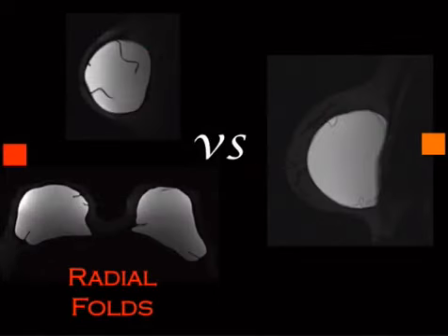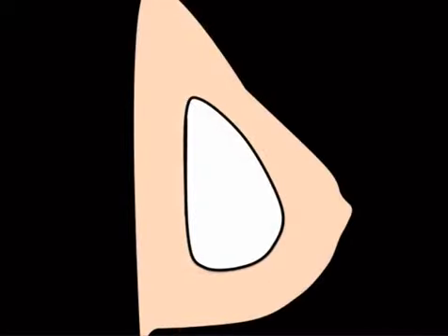And you could probably imagine that this other one in orange is intracapsular rupture. So what does that mean, intracapsular rupture? So here's a boob, and we'll put an implant in it, make it a little bigger. This does not happen with saline implants. This is a silicone implant thing.